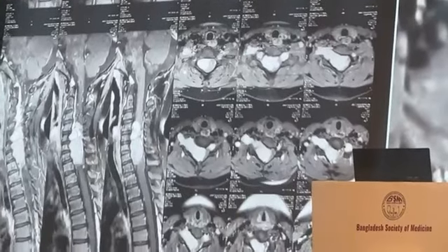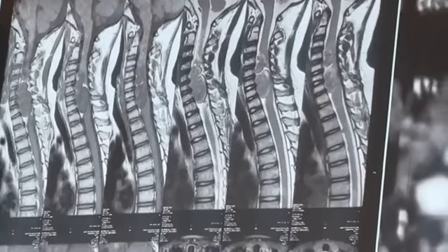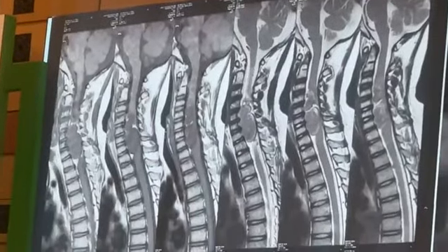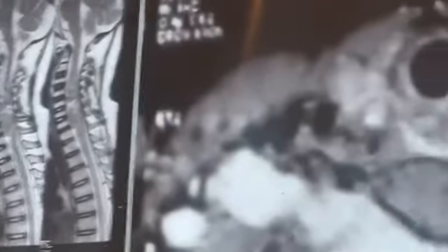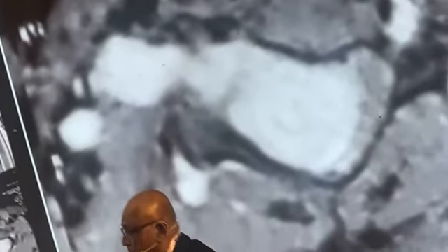Right, this is neurofibroma. Can you see, this is T1 hypo. Much contrast enhanced, bigger, lobulated. And in axial section, we can see it has extended through the intervertebral foramina outside the spinal canal, giving rise to a characteristic feature called dumbbell appearance. So you have the balls of the dumbbell and the handle in between. So that's dumbbell appearance. This is almost diagnostic of neurofibroma.